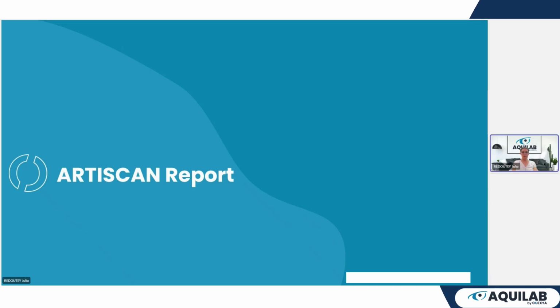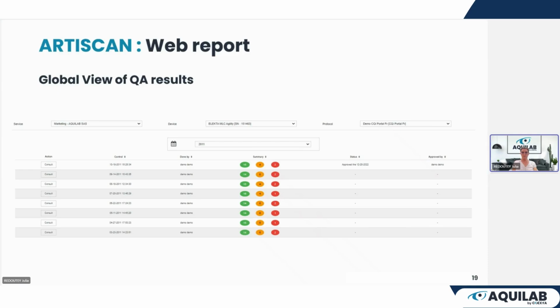Just talk about the web report. It permits you to have a global view of QA results. On the front page, you have a global view of QA. You can select your control by date, device, or protocol. And you can also have a summary of all the controls, and you can see if it's approved or not by the physicist.